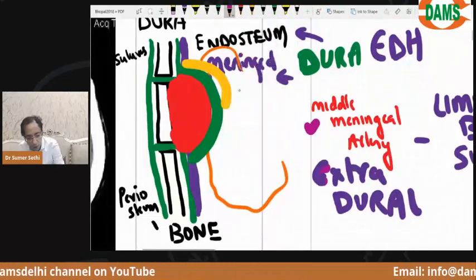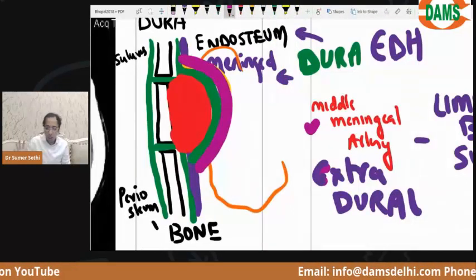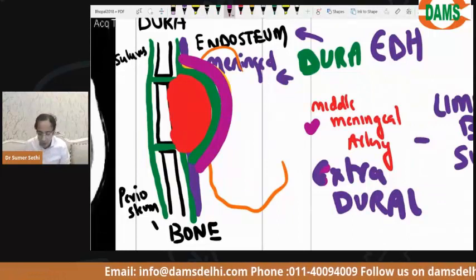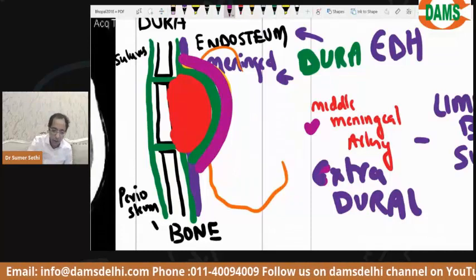Everybody look at it now. Are you able to see now? It is going to push the dura. So we call it extradural. It is outside the dura, but limited by skull sutures.